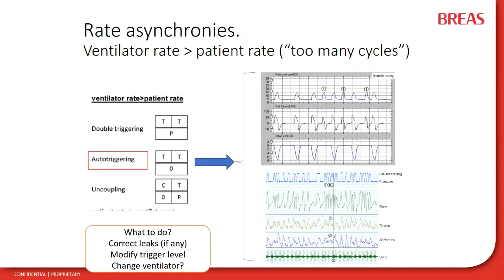Okay. The second possibility is auto triggering. Auto triggering is a cycle or cycles, assisted cycles, but not demanded by the patient.